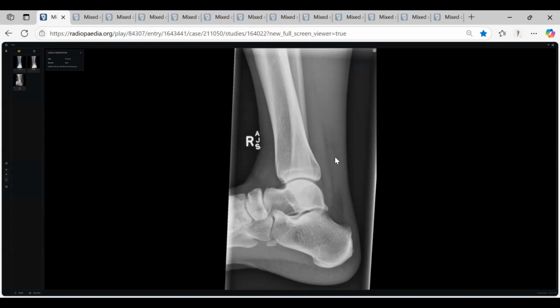If you tell the examiner there is some abnormality and the tendon here is corrugated, this is the muscle, this is the tendon, go up here to the musculotendinous junction, there is at least an abnormality. If you tell the examiner, I could pick up an abnormality here, I want to do an ultrasound, he will be happy.